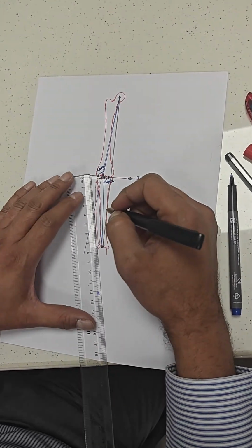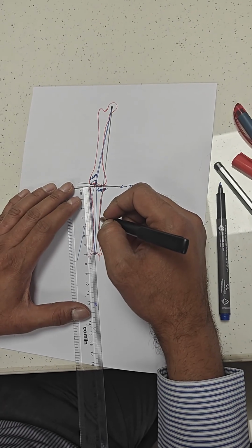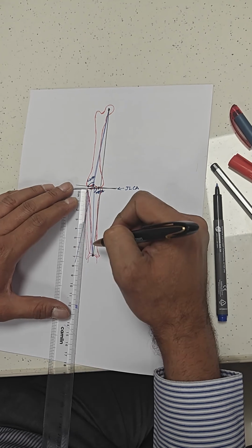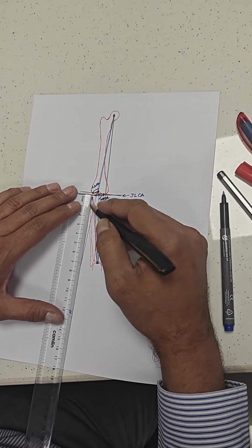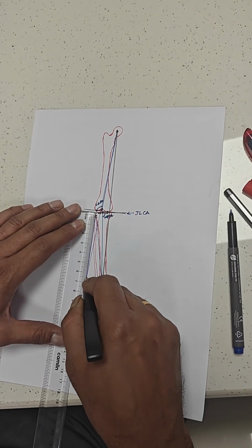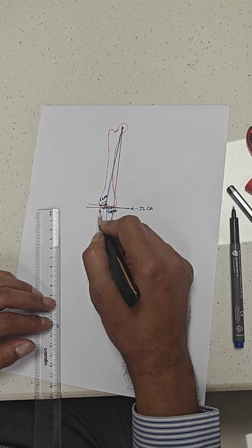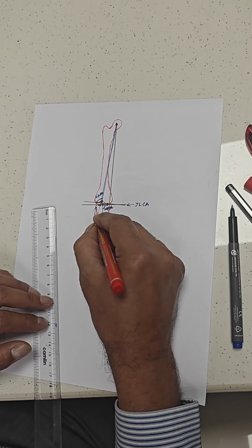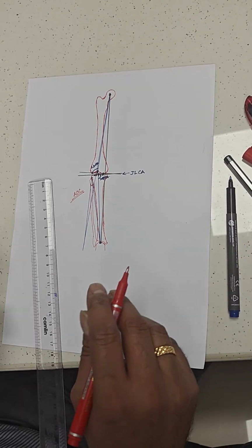From there we draw a similar line of the same measurement of 7 centimeters, which was from the lateral exiting point to the center of the ankle. The same length line we have to draw, and we intersect that line with the line drawn from the head of the femur through the Fujisawa point. So this is it. This is now the angle of correction. Angle of correction. Thank you very much.